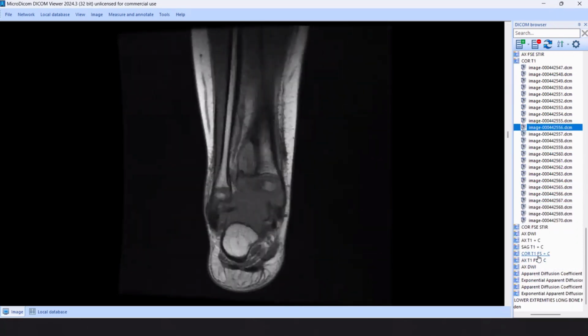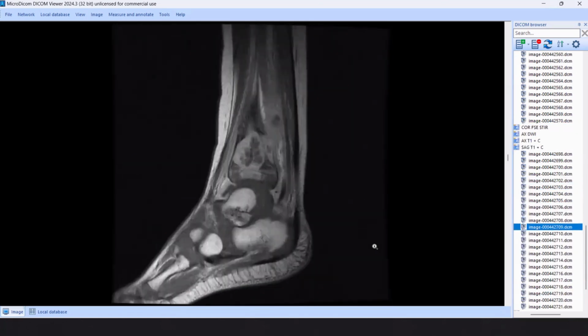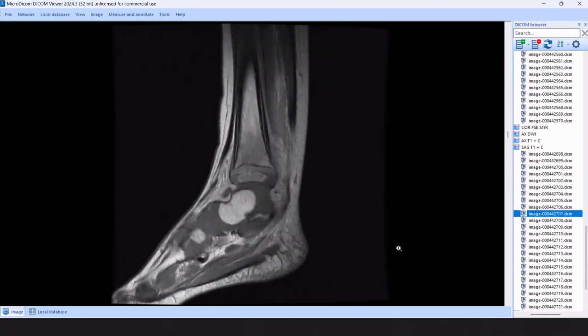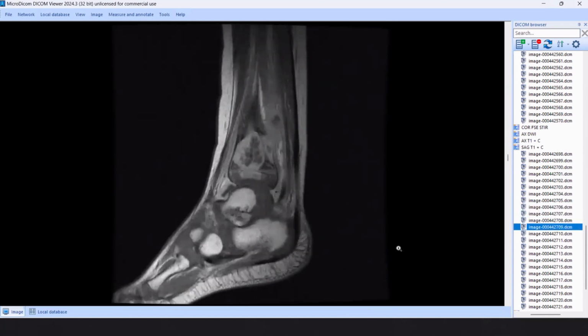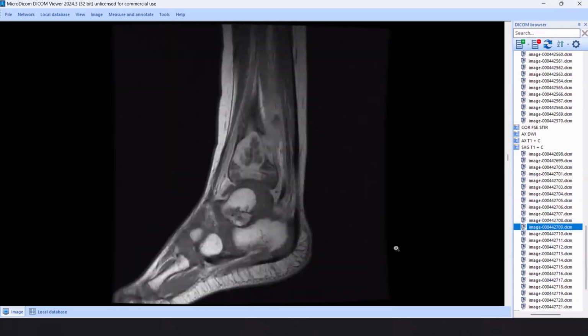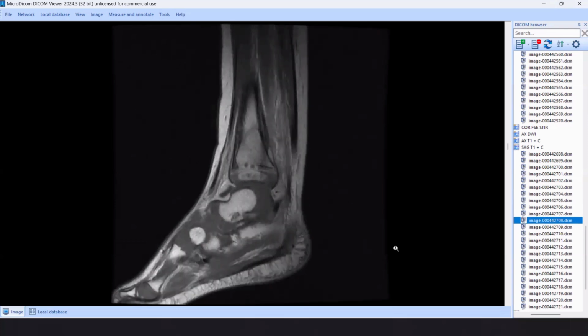It's very progressed. Also, I would like to show you the sagittal. Look for the lesion. I think we have here an extraosseous soft tissue. Yes. And also, it's very clear to have extension across the physis into the epiphysis of the lesion of the tibia. Can you add something here? Is there any more data that you can see in this image?